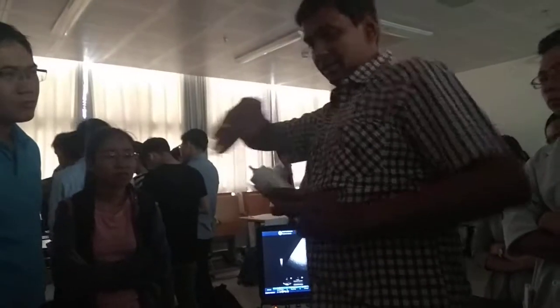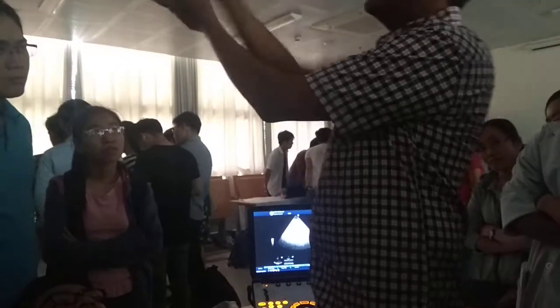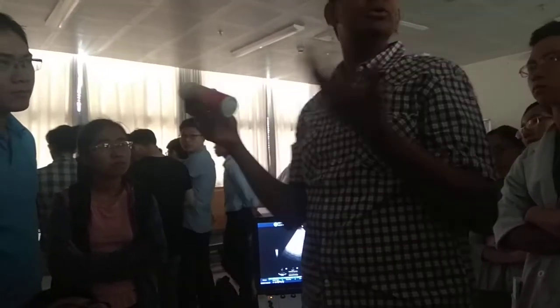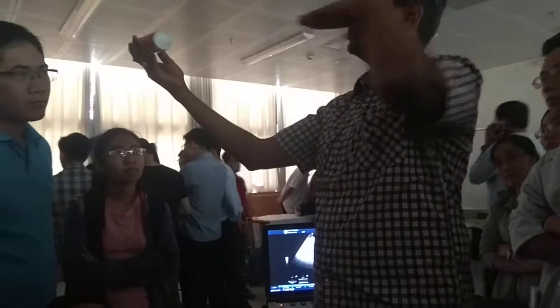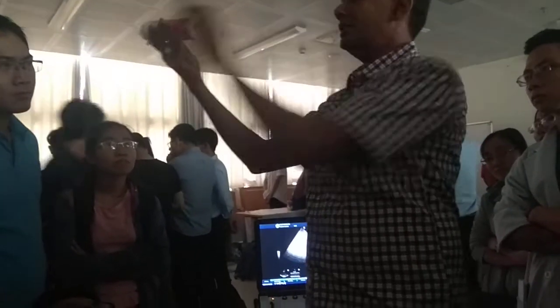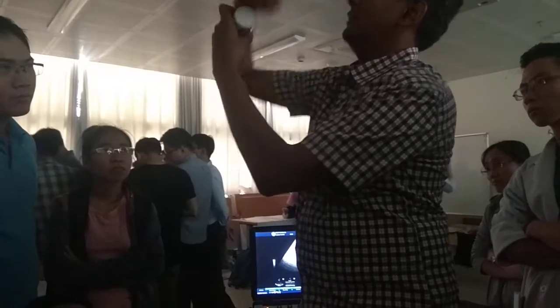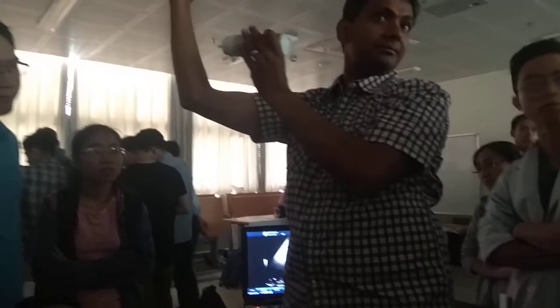If you think of the CT scan, sagittal is this, cutting from anterior to posterior in this direction. So that is a parasternal long axis view. Apical is a coronal view of the heart. So it cuts the heart in this direction, and then it opens up and shows it to you like that.